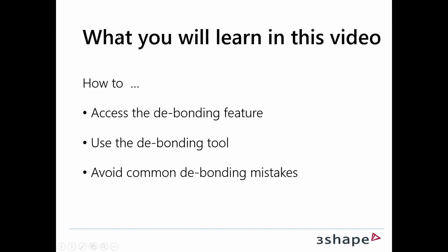So what you'll learn in this video is how to access the debonding feature, how to use the debonding tool, and how to avoid common debonding mistakes.